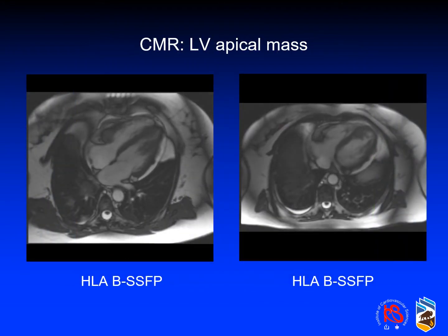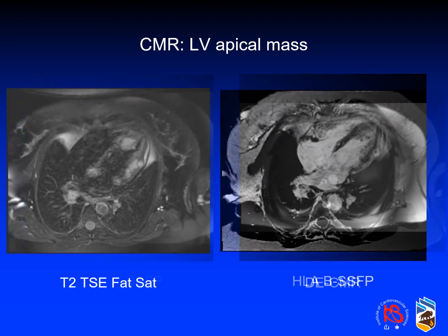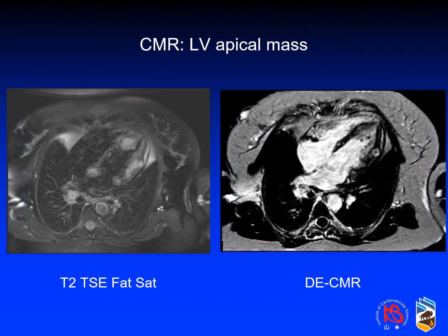When we did cardiac MRI on this patient, we can see that there are multiple thrombi present within the LV apex, in particular involving the distal interventricular septum. On the T2 images on the left, we can see the masses present within the interventricular septum and lateral wall that are hyperintense and white. And when we give gadolinium to this patient, we can see that the masses do highlight.